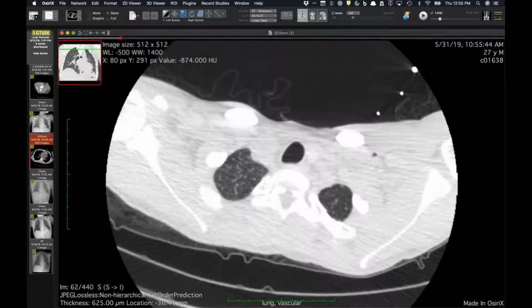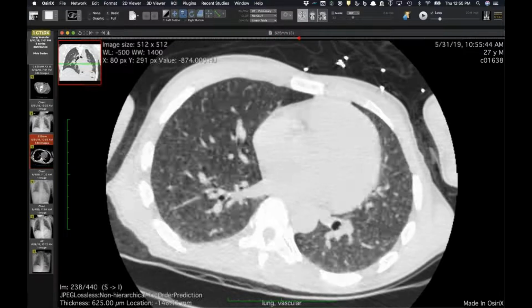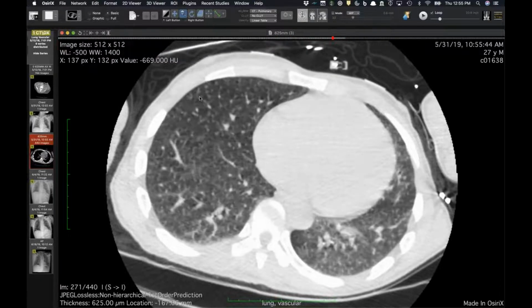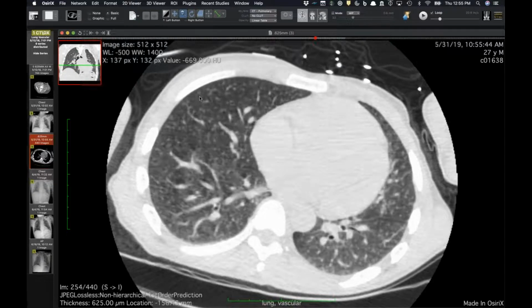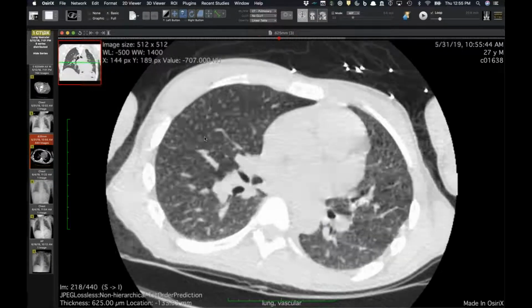She found the outside study from a few weeks ago, and this was called miliary disease at an outside hospital. Of course, it's not miliary, it's centrilobular, and you can see how it spares the pleural surface, and they're very discrete little solid centrilobular nodules.